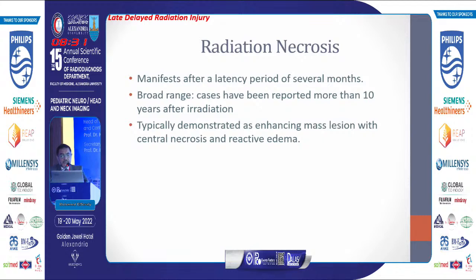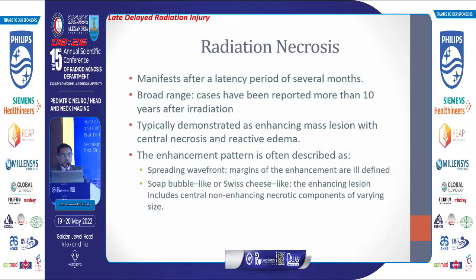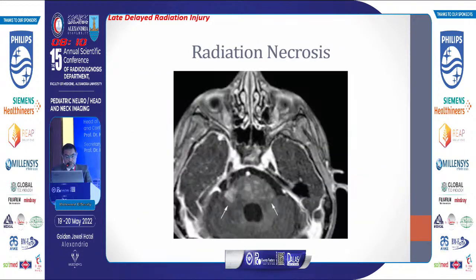It is typically demonstrated as an enhancing mass lesion with central necrosis and reactive edema. The enhancement may be ill-defined or show a soap bubble appearance, with a necrotic component surrounded by marginal enhancement, and multiple lesions can occur. It's very uncommon in the pediatric age group, like in this case, after irradiation, which showed multiple small foci of enhancement in the brain.